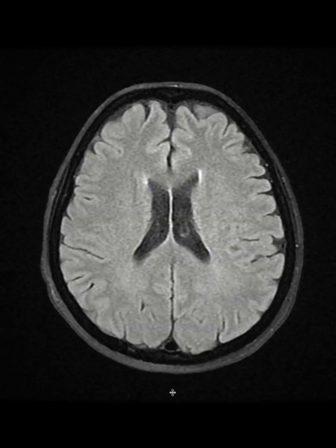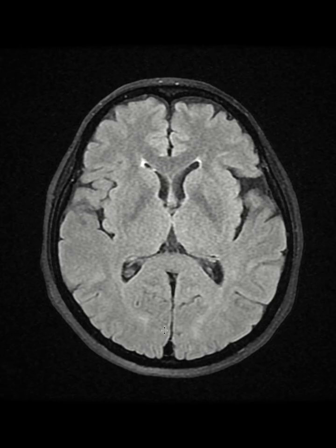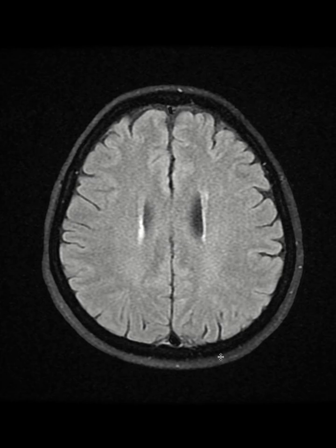Next one is a FLAIR, which is a very important sequence on neuro MRI. As we see here, basically everything is a T2 sequence, except CSF is going to be saturated out. So basically anything that is CSF is going to be dark on this sequence. So that's the difference between FLAIR and T2. You see that the CSF in the ventricles is going to be dark on the FLAIR imaging. On this one, specifically in our institution, we do it with fat sat, so you see that the fat outside in the scalp is also dark.